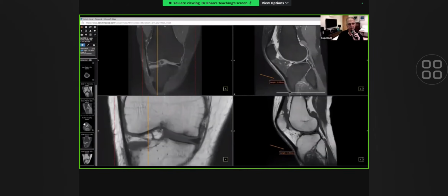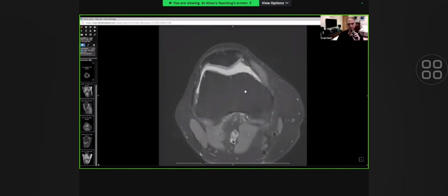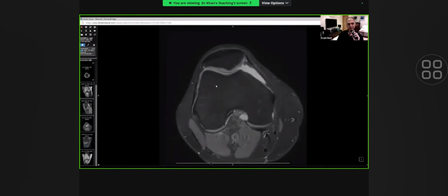So have a look at the axial imaging now to see if the trochlea looks dysplastic to us. Knee joint effusion, it's reasonably well formed, so I would not be too fussed about that. Patella is also not laterally subluxed, it's holding its position. And the angle between the medial and lateral corners of the patella is not too far tilting.